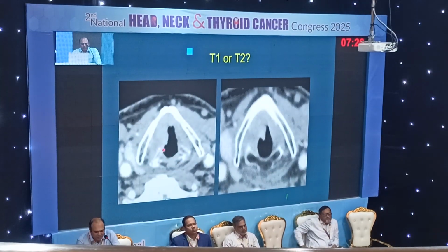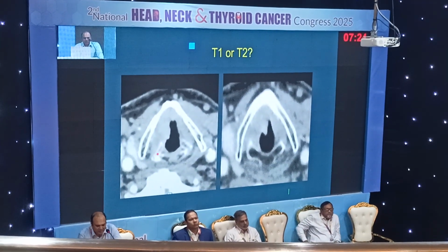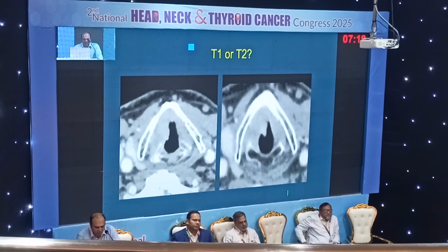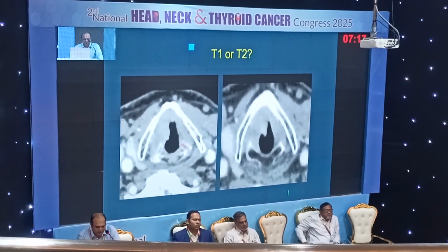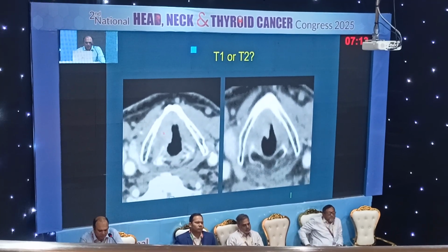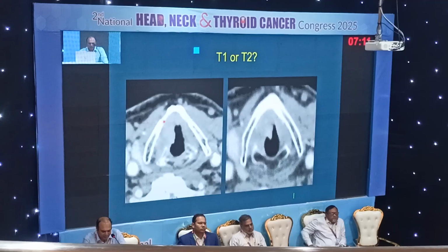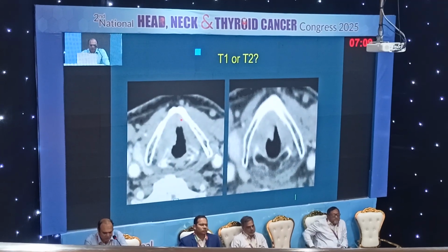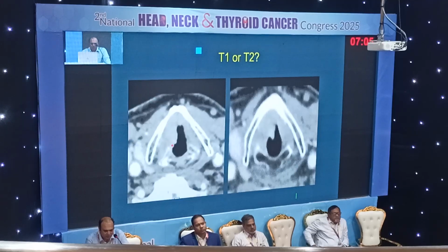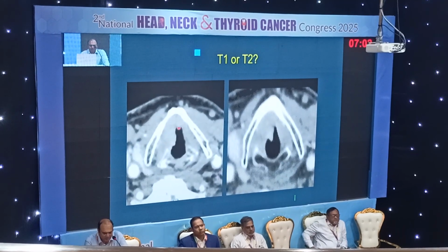Okay, so you have a lesion here. It is an enhancing lesion. Again, what level? We are at the level of the true vocal cord, because you are seeing the arytenoid cartilage, the thyroid, the cricoid. You can see an enhancing lesion there. Can you make out an enhancing lesion there? It is an extending anterior commissure lesion. So if I contour this tumor radiologically, this will be my GTV. Dr. Suman, if I am wrong, please correct me.